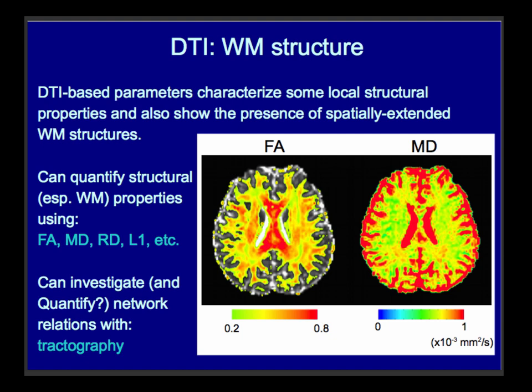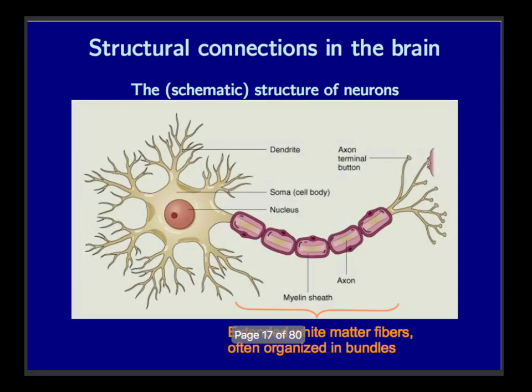And then we also have this interest not just in this isolated bit of white matter here, but especially with white matter, we care that it's providing a connection. So we care about sequences of it all along the way. And so how can we look at network properties or these non-local properties as well?